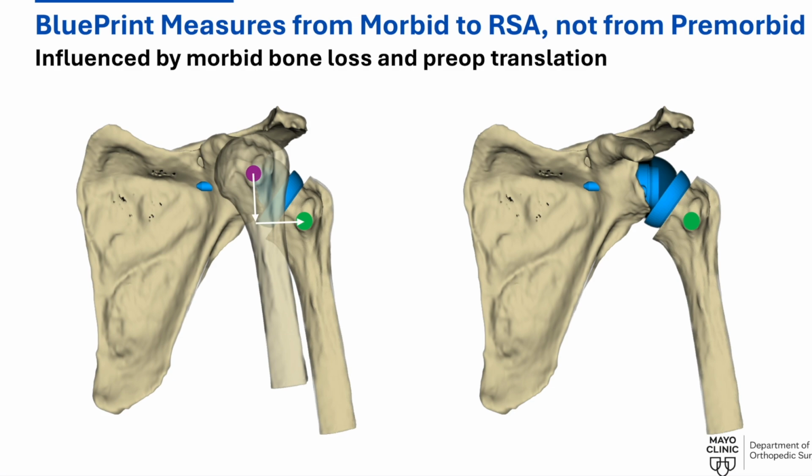So when you make the calculation, people will tell you you are lateralizing and distalizing a fair amount. But you're reaching the same spot as the image on the right, and the image on the right corresponds to a patient that has a massive cuff tear without arthropathy. You can see how the purple dot stays at the same level in terms of lateralization and is just distalized.